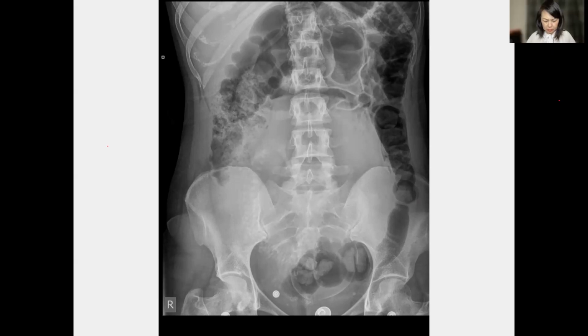Intussusception, not in this case. Rib fracture, no, that is a costochondral calcification. All this is not fracture. It's at the anterior ribs, so that's normal. Some said toxic colitis. Toxic colitis, no. A bit prominent, okay.